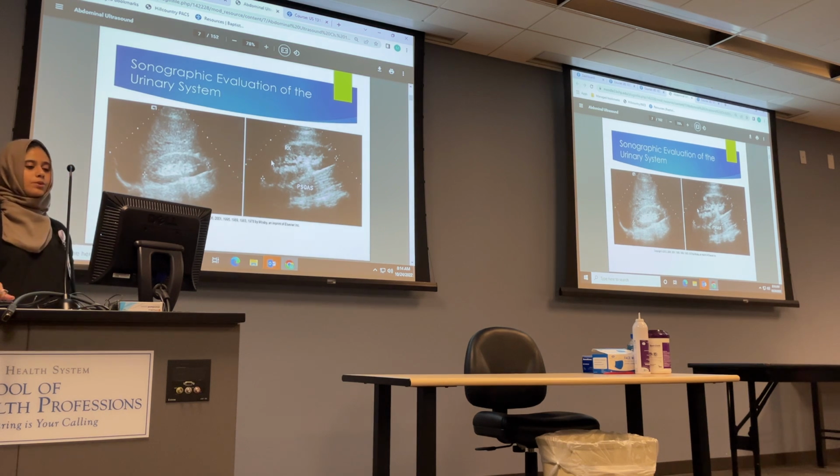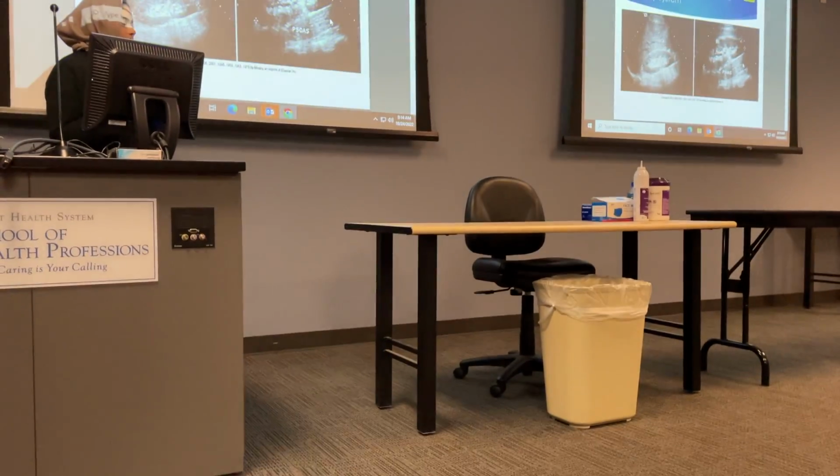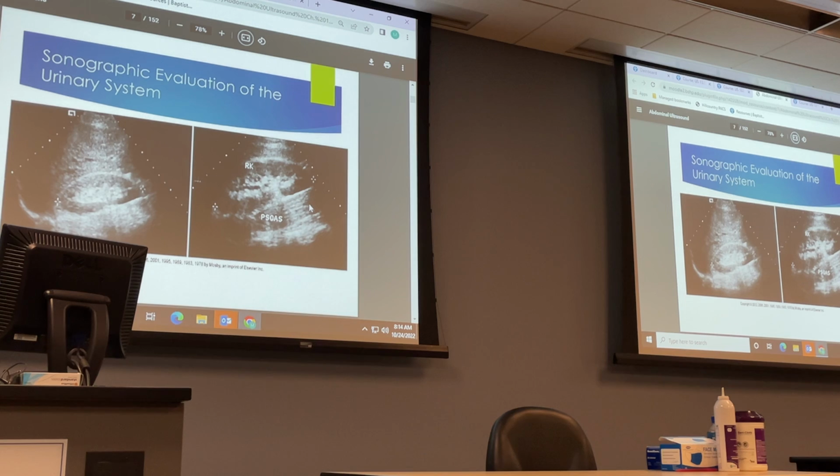Remember, in a longitudinal view, this muscle behind the kidney is the psoas muscle. Remember that even in lab, behind a kidney, if I point out a muscle, the only muscle you guys have learned that you can see on ultrasound behind the kidney is going to be your psoas muscle.